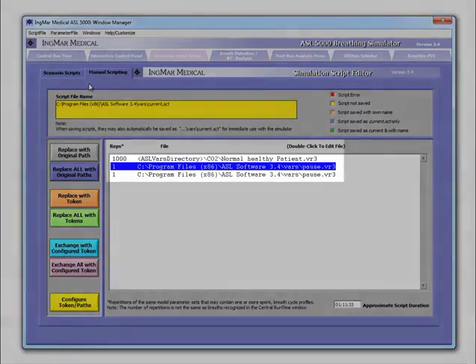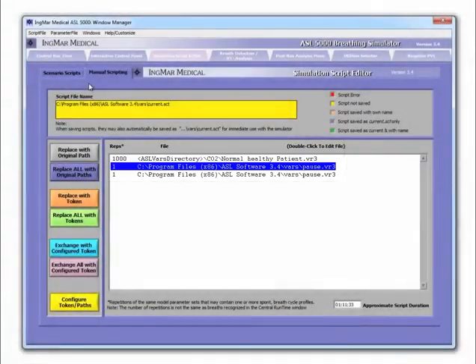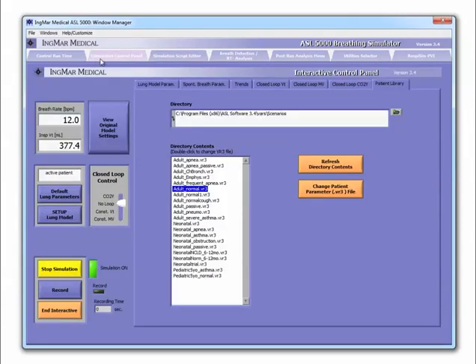So for example, here we have 1,000 breaths of this occurring, whatever this normal healthy patient is, and one breath of a pause and then another breath of a pause. So that's pointing to a specific file and then asking it to be run whenever we run our simulation. Again, this is a little bit different than what we did here, because here in our interactive panel, we're just saying, I want to run this file or this lung model, and I want it to keep running forever until I change it or until I click something else.